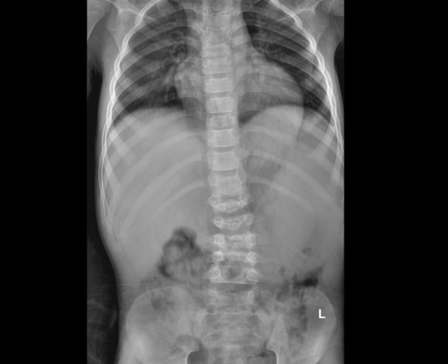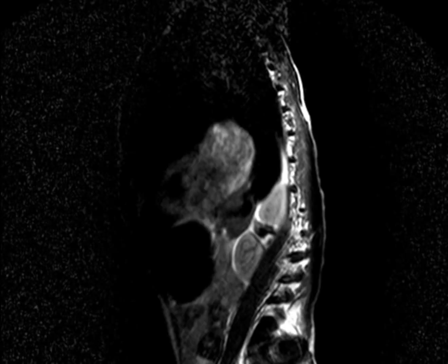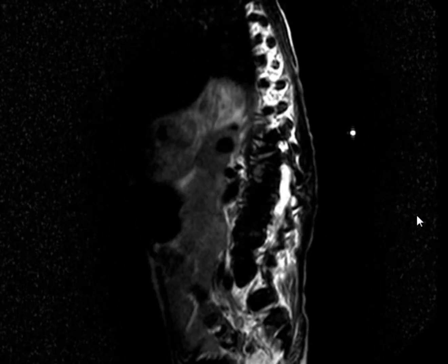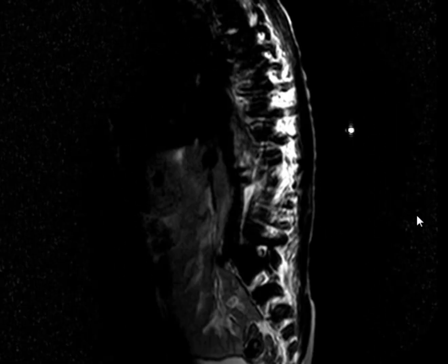And now you have this MRI. So what do you see?